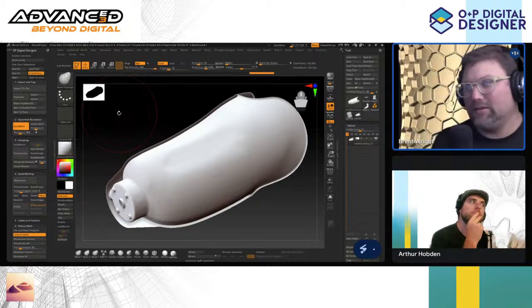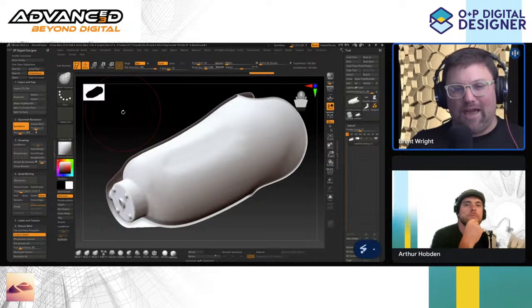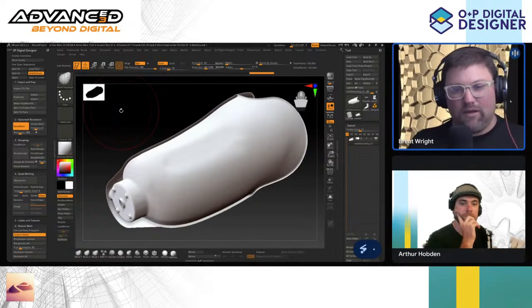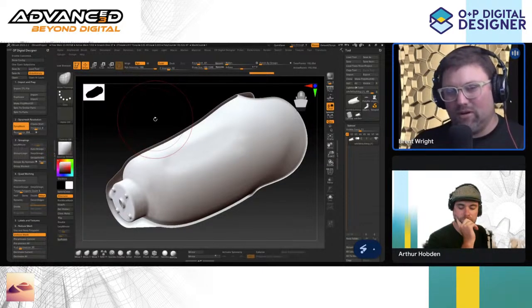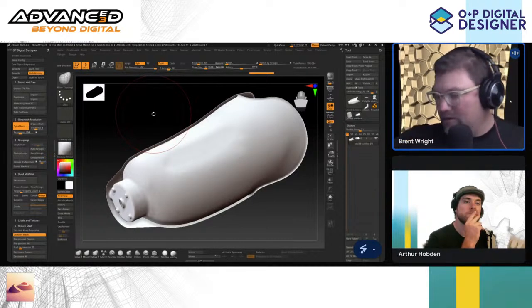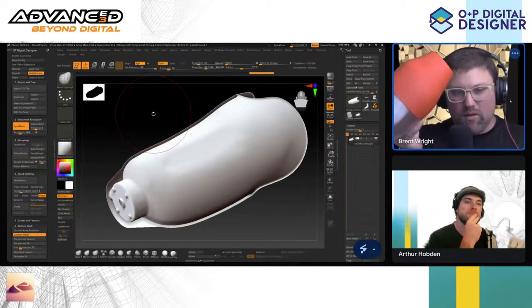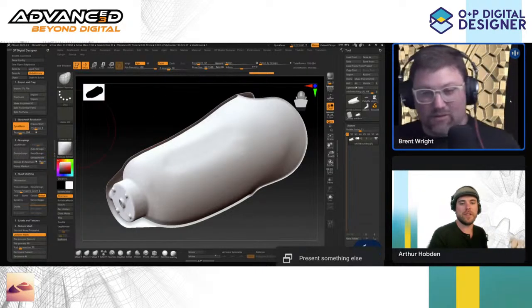And so when I think back of all the things that I've done, this just gives access right away to something that is going to be a sound design. Now it's up to you. Your mileage may vary based on what printer you use and all that stuff. But as far as the way to design for FDM, this is a great, very strong way to do it. In fact, I've got one right here. Oh, cool. And it's just with not a lot of experience, right? Yeah. You're just dropping it in.